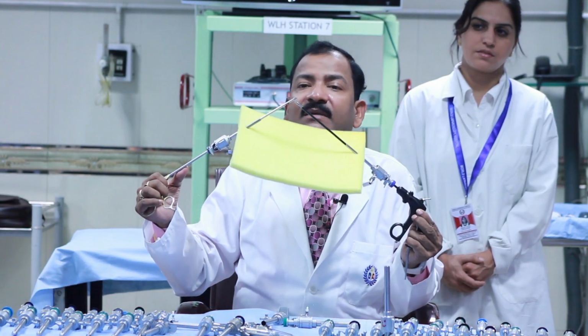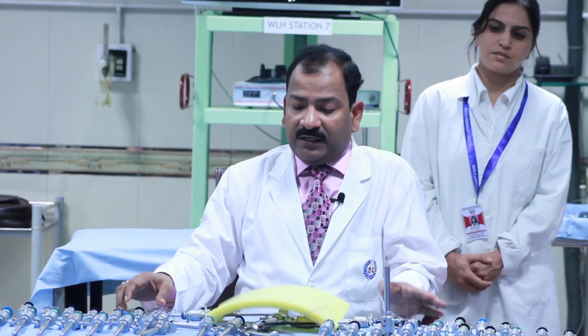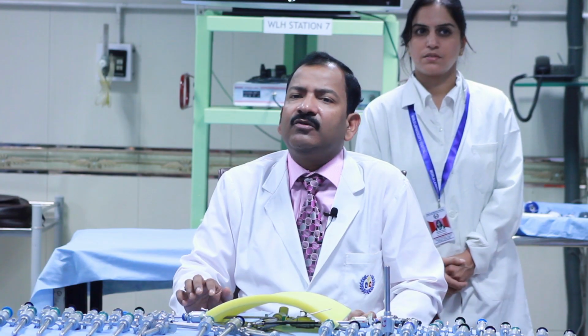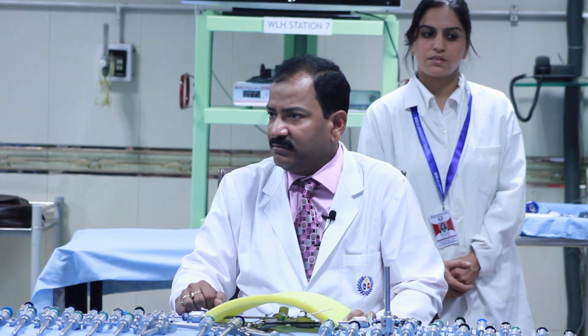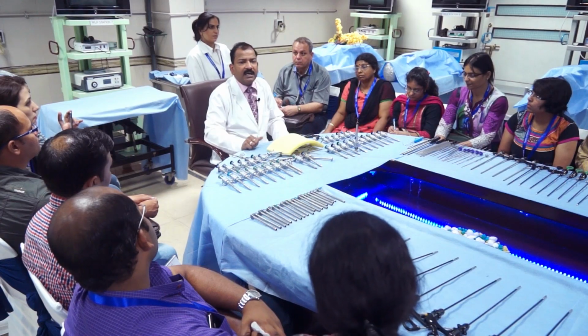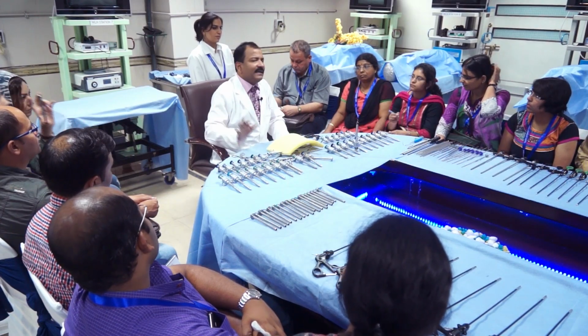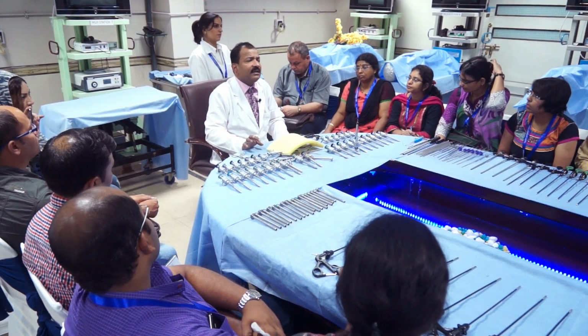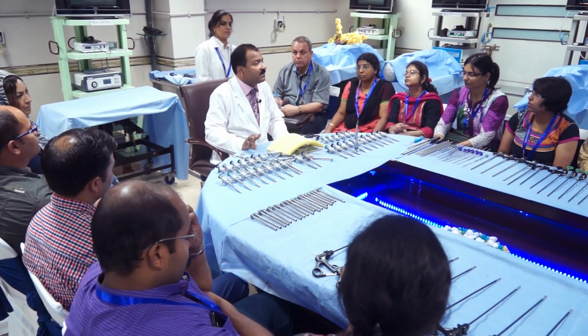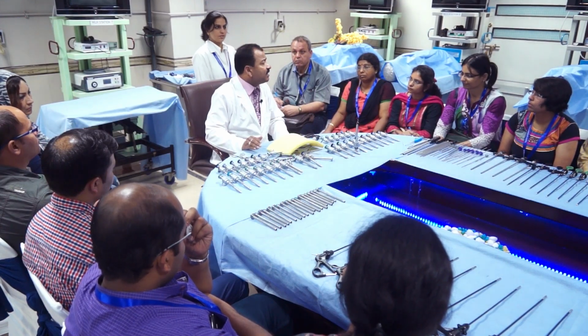Your manipulation angle depends upon your port position, and you do not know where to put the port. You put one wrong port, your manipulation angle is wrong, and now it does not matter how much experience you have or how good a surgeon or gynecologist you are, you are committed to make the mistake. You will damage the ureter, you will damage the uterine artery, you will struggle like anything. At the end of the surgery, you will cry, what happened today, I could not do anything good. How can you expect to do anything if your ergonomics is not good?